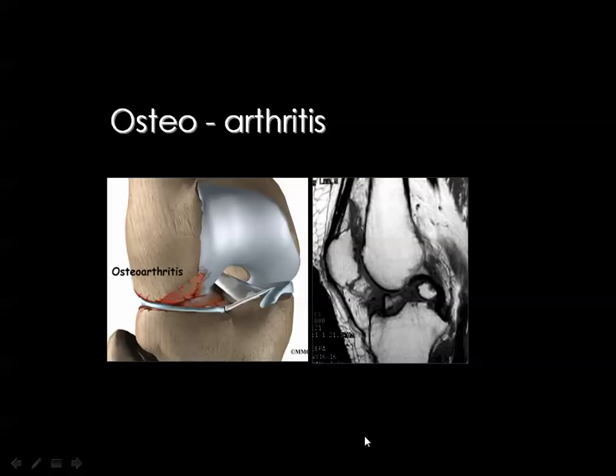In osteoarthritis, you get the usual manifestations in the knee, and as in any large joint in the body, these manifestations will include certain pathologic entities. One of them is the development of loose bodies. And you should know that if the loose body is large, it will develop a marrow cavity, and it will show the same signal intensity similar to the femur and the tibia.